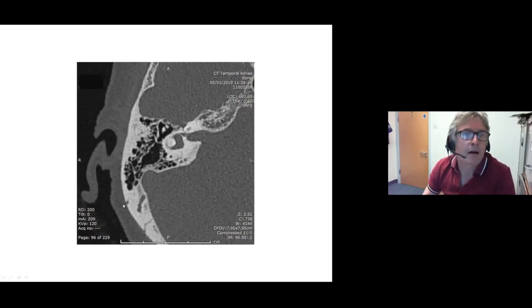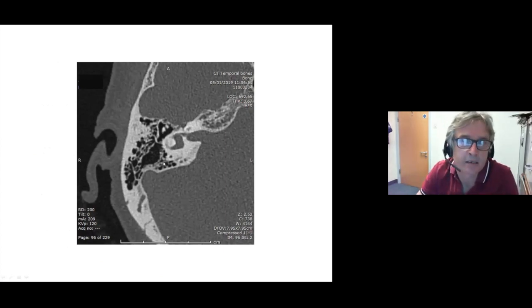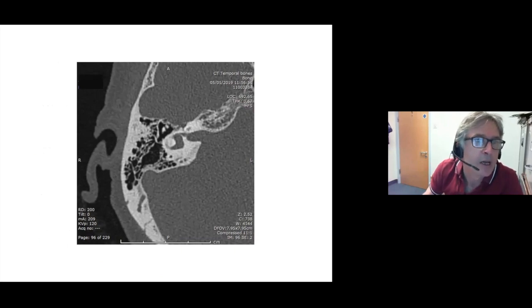So, I think it's fair to say, when I'm looking at the ossicles, I'm primarily using axial imaging to assess whether the ossicles are normal or not. And I think it's the easiest orientation to assess whether there's any subtle erosion, whether there's unusual anatomy, whether there's an unusual gap between the ossicles, or whether bits of the ossicles are missing. I would say the axial images hold sway.